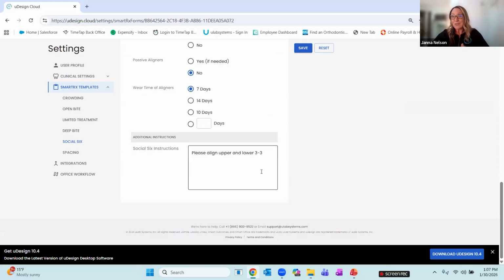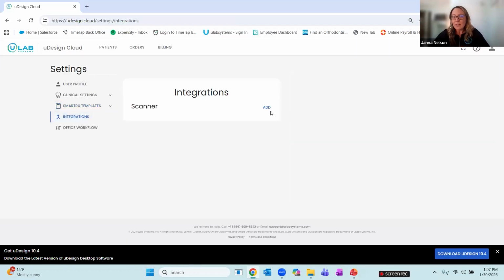and to your liking, so there's less back and forth modification. So I always like to point out the additional instructions. I think this is really important, that whatever you're wanting for that specific case, specifically more complex cases, you want to make sure that you have all of the details in there. Super important.